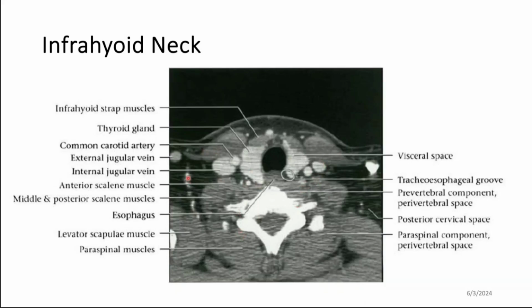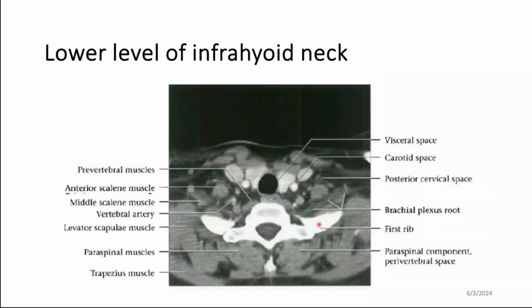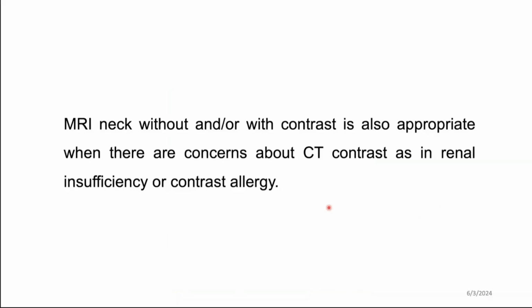So we see some lymph nodes in the neck also. So it really helps giving intravenous contrast. Right. This is even more inferior. We see the left lobe of the thyroid, right lobe, trachea, and the vessels and the anterior muscles of the neck.